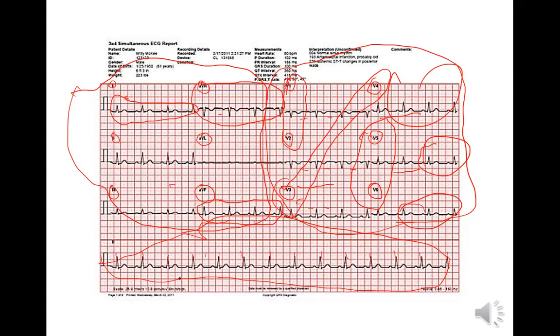So this is lead 2. And it's good. And then you look for P waves and make sure they're normal P waves. And the PR interval is normal at every beat, followed by a normal QRS at every beat. So it should be P, QRS, with a normal PR interval between 0.12 and 0.2 seconds.